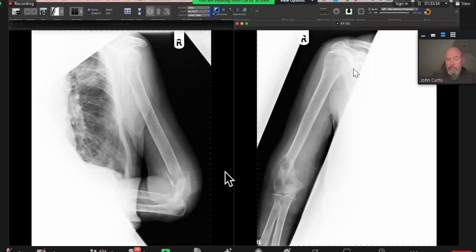Okay, how do you think you did? I think I did okay. I think you did really, really well. I'm going to go through each film in turn, for the benefit of the audience, because I thought you did really well, but also just a bit of teaching around the films.